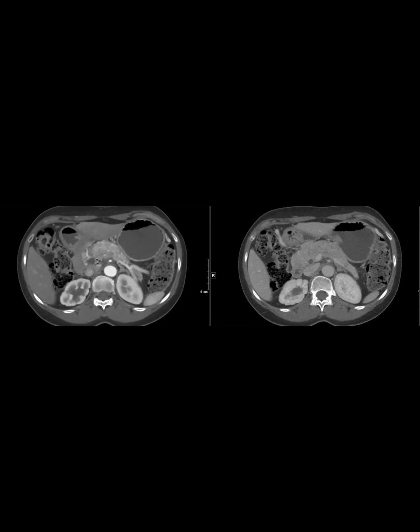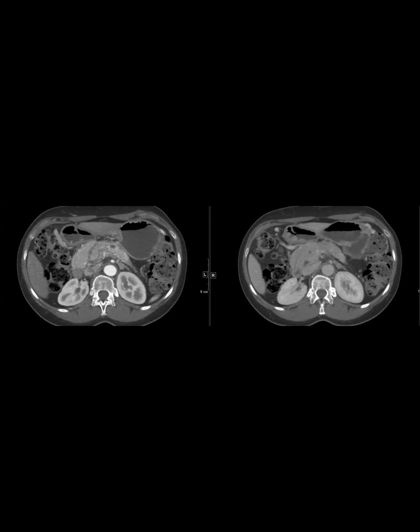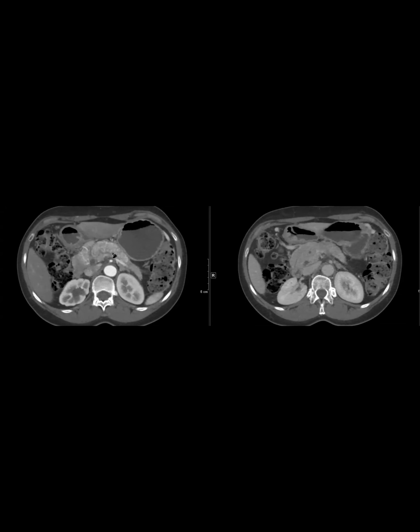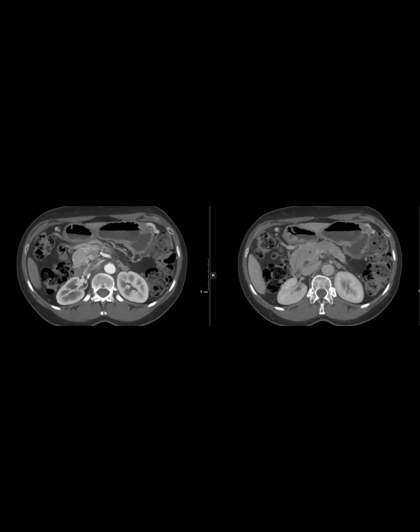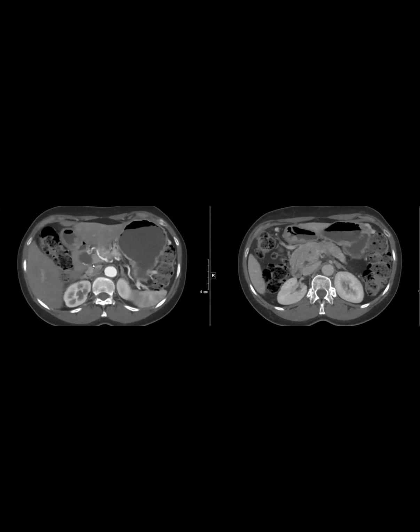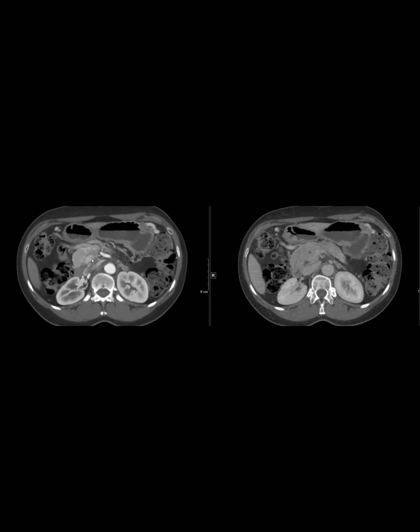Okay, so this is a case, and in keeping with a pancreas theme, not intentionally, this is a fairly old case from 2013, so I can't tell you what the symptoms were or why, but here's the finding. Any thoughts? Kind of like a malformed pancreas, like it's not fused properly. Right. So that's one thing. This bud doesn't seem to be fused with this one.